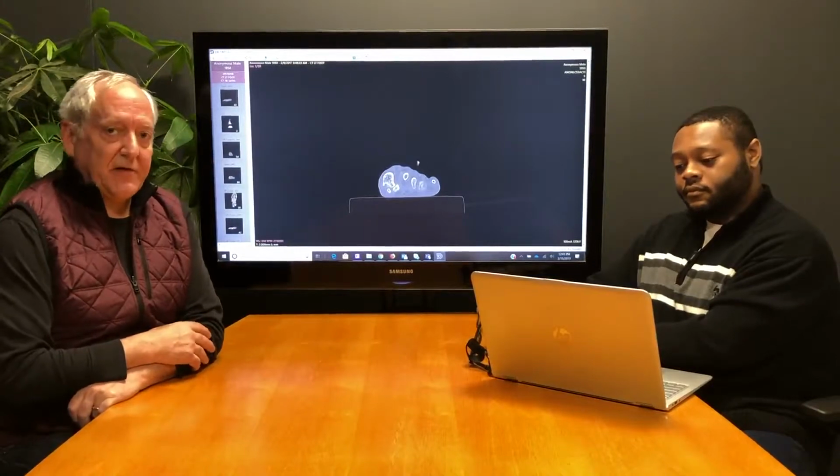I see. So they'll receive an email saying that the series has been loaded, and then they'll receive a PIN number on a telephone to bring that security to it. Yes. Okay, great. Let's take a look at our 3D model construction now, Ron.